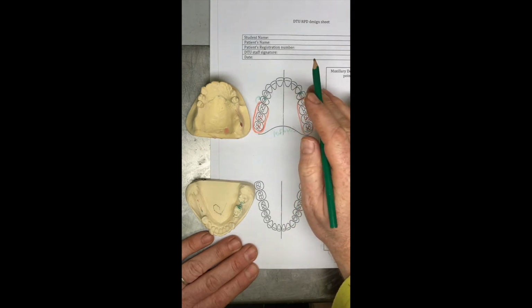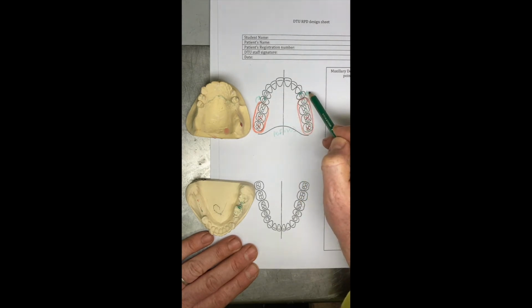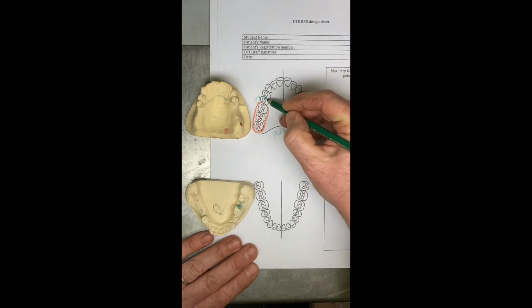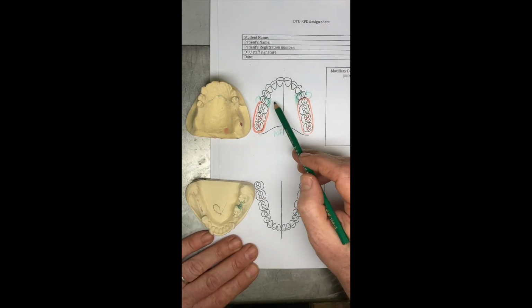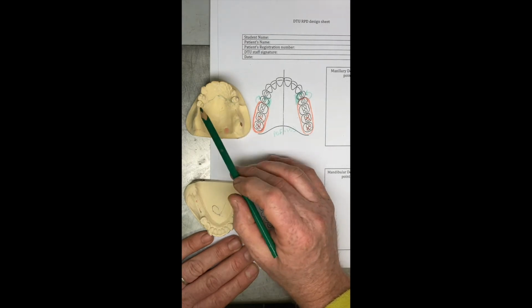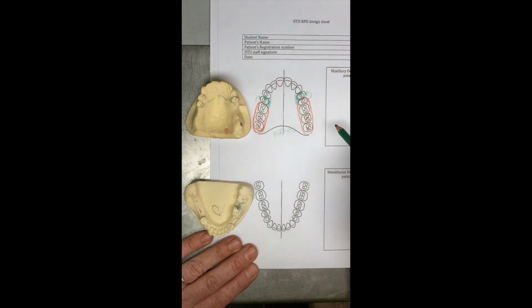And then once we've got our clasps on and we've thought about the path of insertion, that's the retention taken care of, we can think about reciprocation. So everywhere we have a clasp tip, we need to put reciprocation on the opposite side of the tooth, and by default I go for reciprocating plates because they're simple to make functional. You can go for reciprocating arms or the RPI system in this case. For both of those, you'd need to be back on the surveyor looking at this side of the tooth to see whether the reciprocating arm is going to be effective. And if you're doing the RPI system, we're going to need a guide plane on the distal aspect of the tooth and thinking about where the minor connector is going to be opposing the clasp tip.